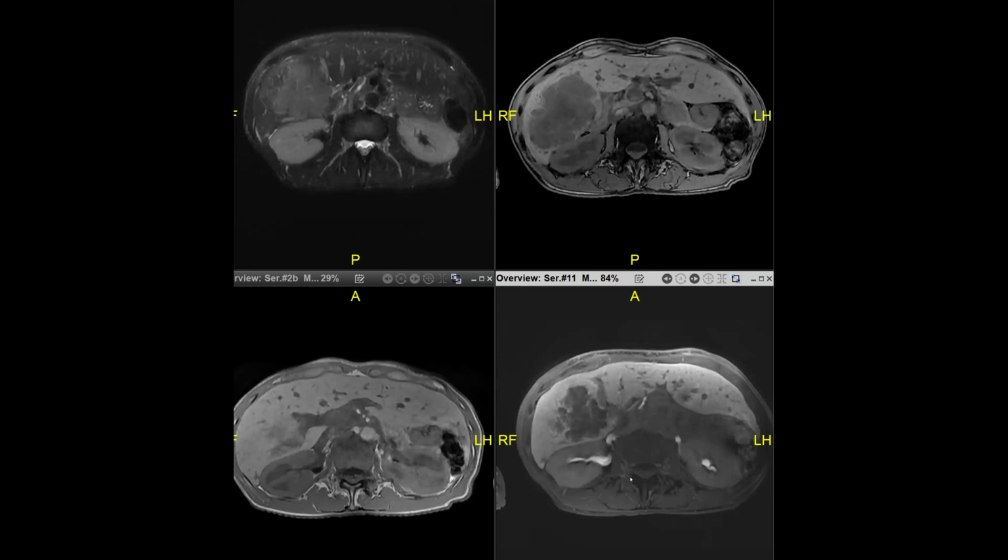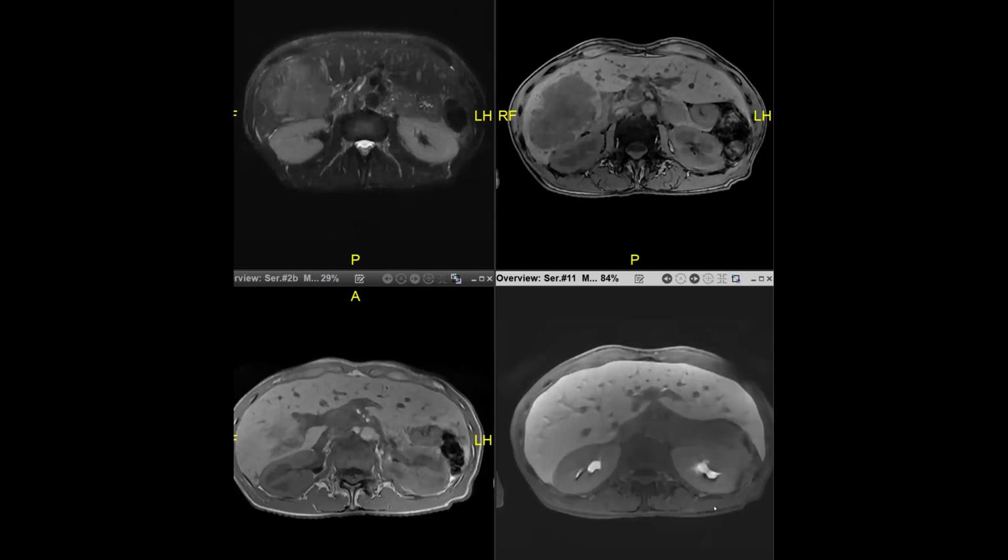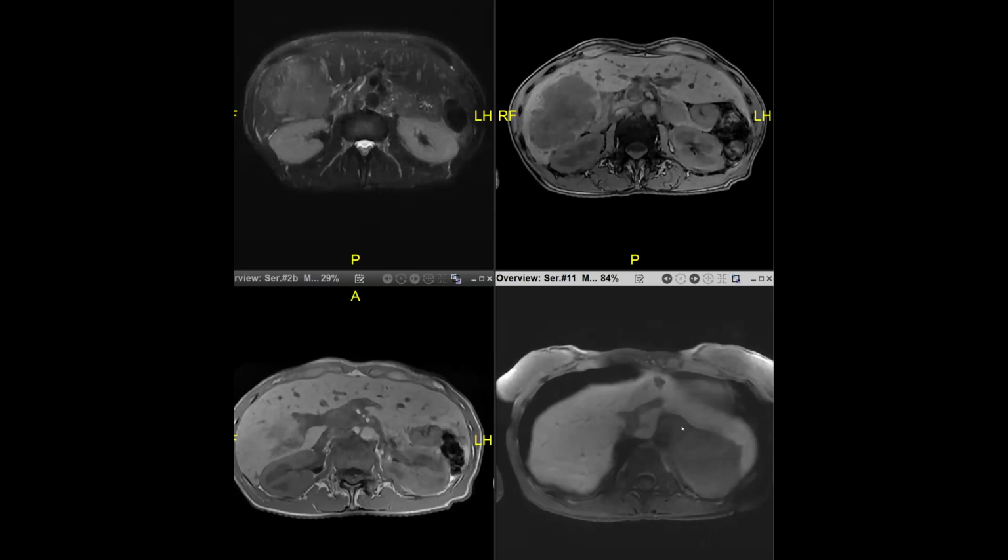sometimes for colorectal liver staging. And diffusion I love because it really pops out on diffusion, whereas you could really miss those small ones on other phases. The one at the right dome, sometimes that's a tricky area for diffusion, like you lose your diffusion, but it looked like in yours you still saw a little bit.